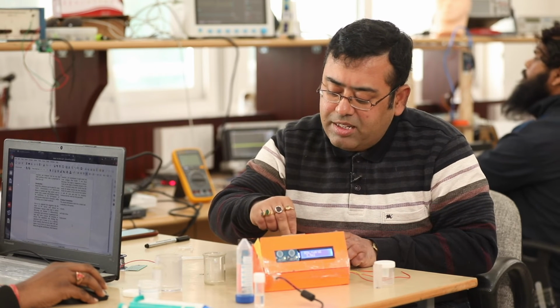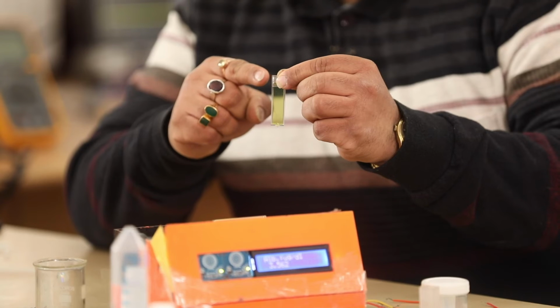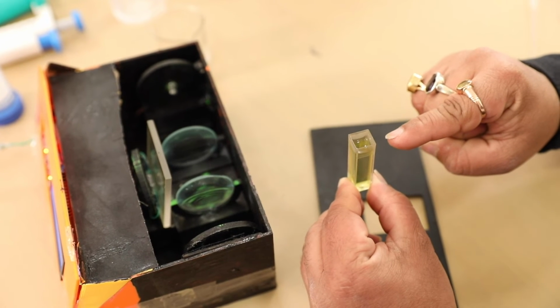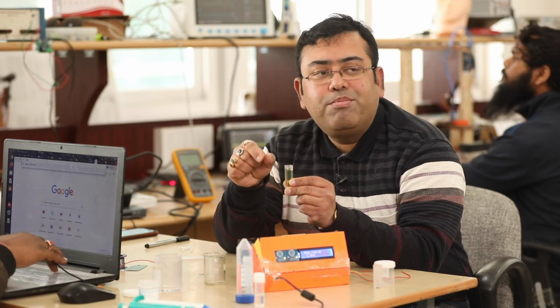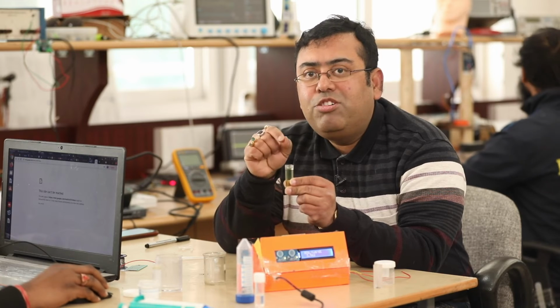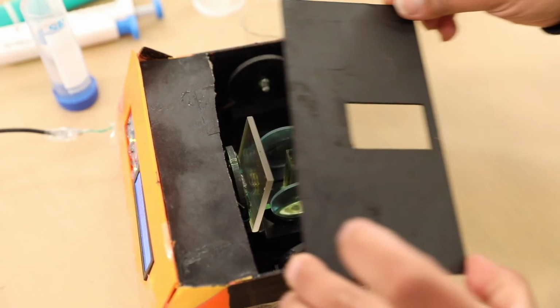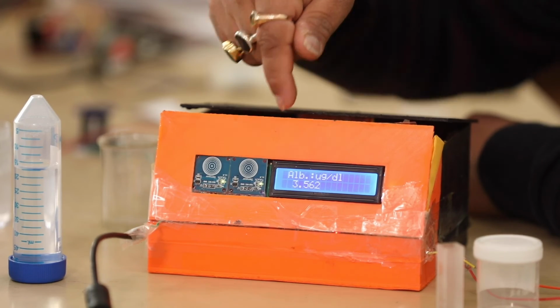So, I am putting the cuvette over here. This cuvette has the urine plus dye sample, where the urine is collected an hour before and the dye is mixed with it. So, the incubation period is 1 hour. For 1 hour you have to keep this urine plus dye sample as it is. This is the incubation period. After the incubation period is over, you put the sample over here, then cover it, and now you get the result in the display.